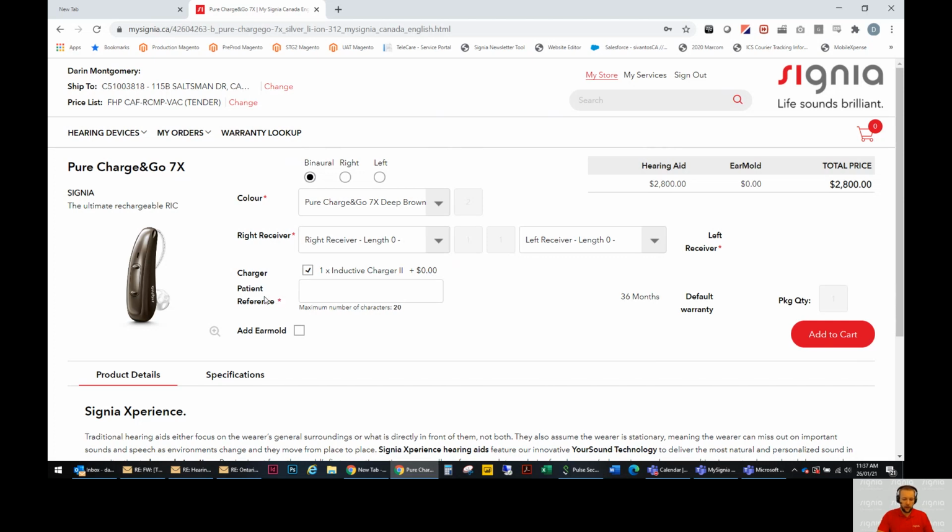We are then invited here to type in a patient reference. So this would be the patient name. So I'm going to go ahead and just type in my name here.